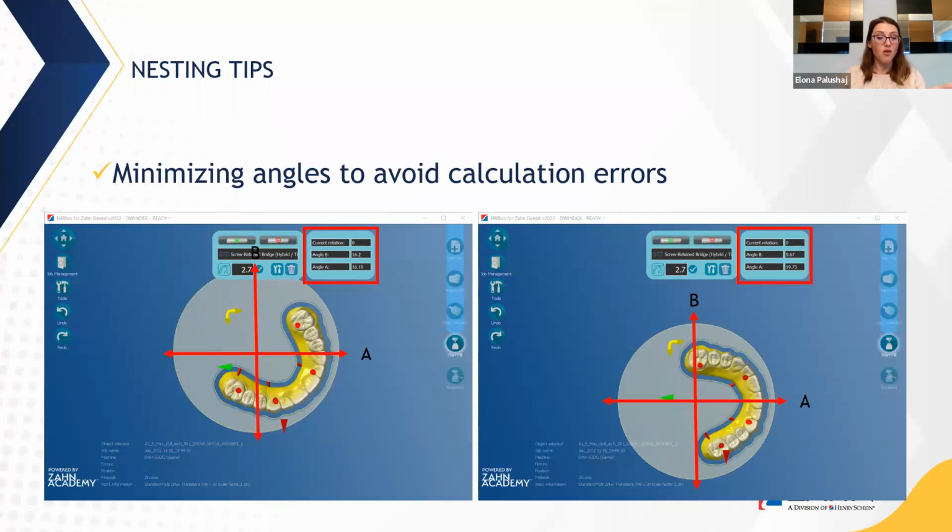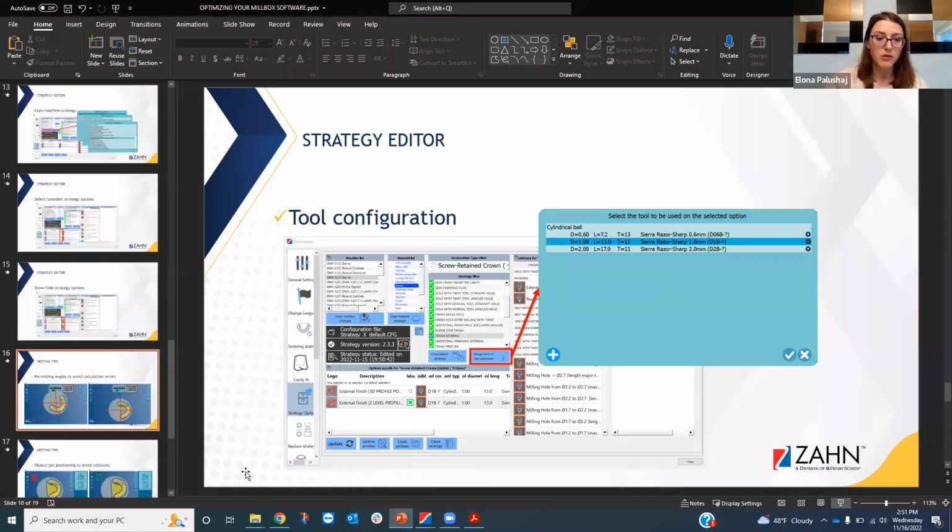So as you can see on the left side is how the software imported the unit. It's got angle 16. Those are perfectly acceptable. This is one example I could find. I couldn't find one that has higher than 30 angles. But you will notice that when I position the unit more towards the 3 o'clock position, the angle B anyway is much lower. So just keep playing with that rotation.